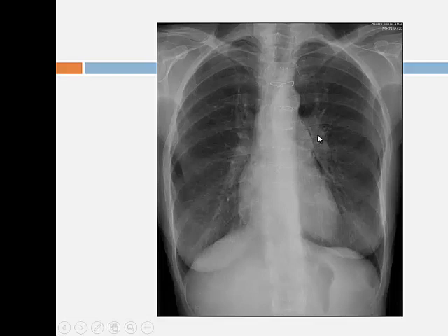Sometimes you can see prominent pulmonary arteries, especially in young people, and it's difficult to get your eye in. If you're not sure, you can err on the side of caution and recommend an echo as an indirect way of looking at the right heart and making sure that all looks normal. Because obviously the difficulty is we're just faced with a chest radiograph. We often don't have any other information other than shortness of breath, so it makes it a bit tricky. I know Nilesh always blames me for saying clinical correlation, but unfortunately, we're not looking at the x-rays, we've got to look at the patient.